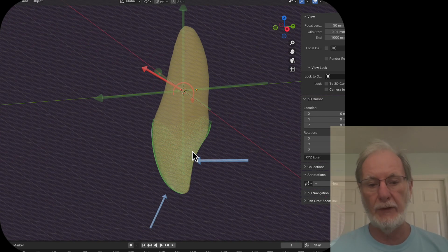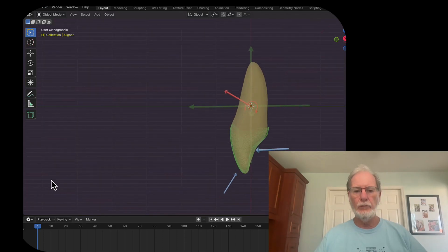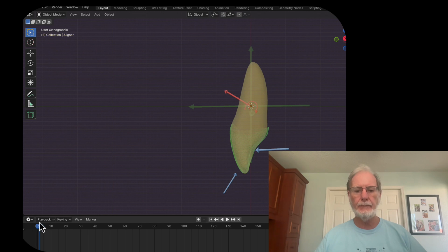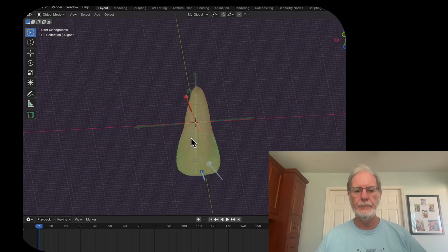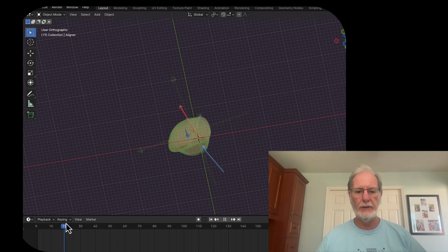You'll be able to vary the force here and the force there and get a different force application and also a different moment. And this is roughly the movement we will attain from this force system. Again, we'll need to get better calculations, but that gives you an idea of what's going on.